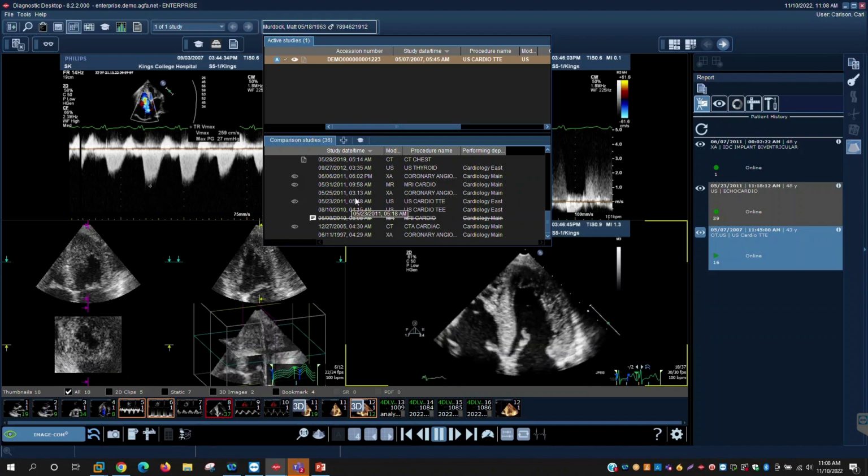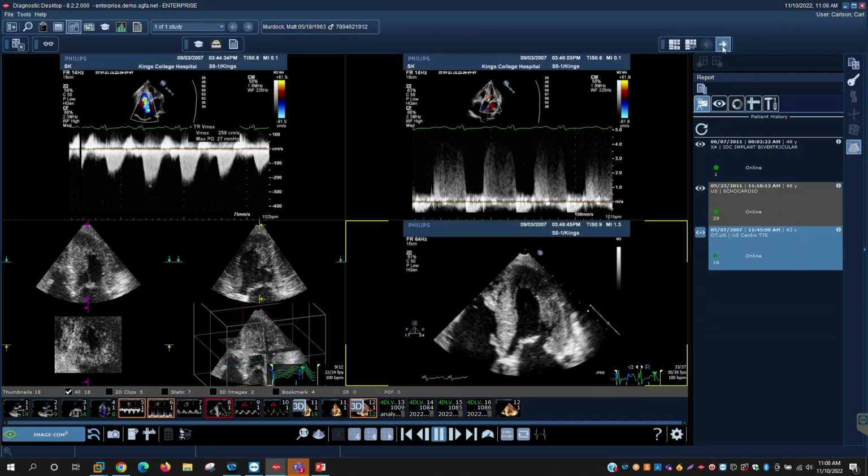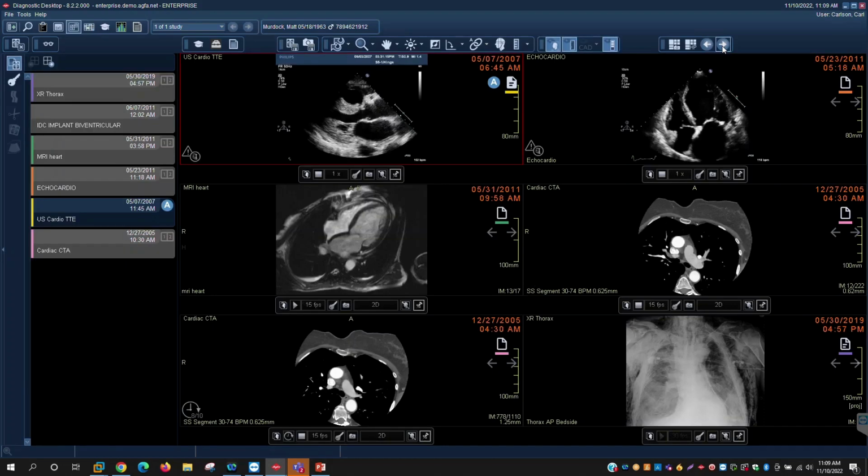So what I'm going to do is advance to another hanging protocol, just with a quick click of an arrow to the right, and this will advance me to the hanging protocol where I want to see my cross-modality specialty. And I've already kind of prepped this one up.